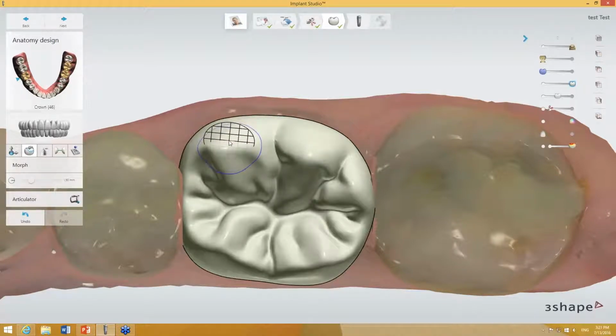There's also one more thing that I need to tell you. If this elliptical shape flips quickly and stays perfectly round, this is when the tool will allow us to make a movement and change of the surface, but not in 3D, not in depth, only in 2D. So from side to side, top to down, but always on the same plane.